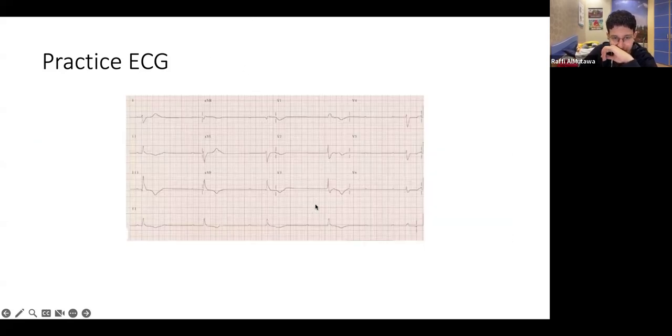It is, in fact, AV taking over. Type 3. T-wave is weird.